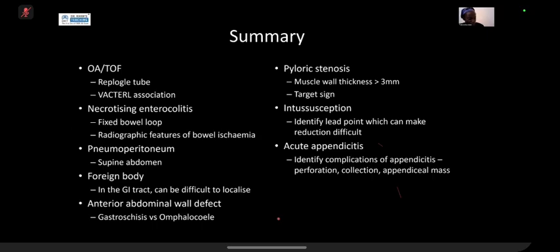And then we've looked at anterior abdominal wall defects. The radiographs aren't to diagnose gastroschisis or omphalocele. That's where you diagnose clinically. The radiographs are to look for any bowel dilatation, which you can see if there's a concurrent atresia or there's been a stenosis. And they're also often there because they've put lines into the patient, so we're doing it to look at the lines. Not often they'll have already repaired it before they've even done the initial radiograph, but those were just some good cases to show you if you've not seen them before, because they could come up in exams.